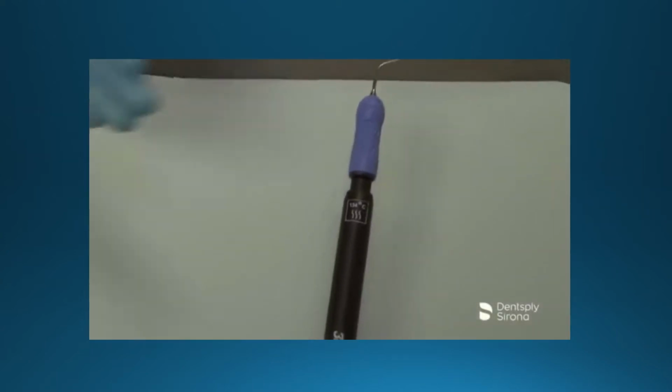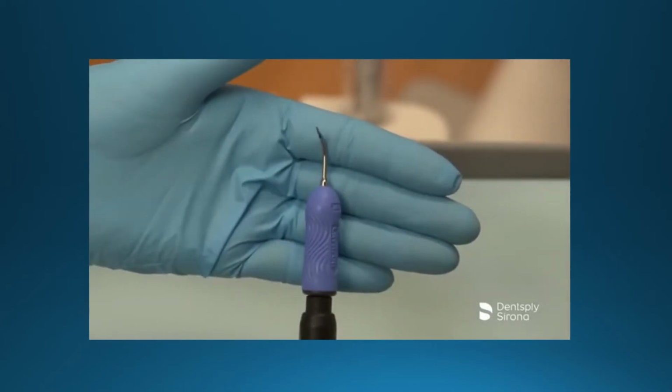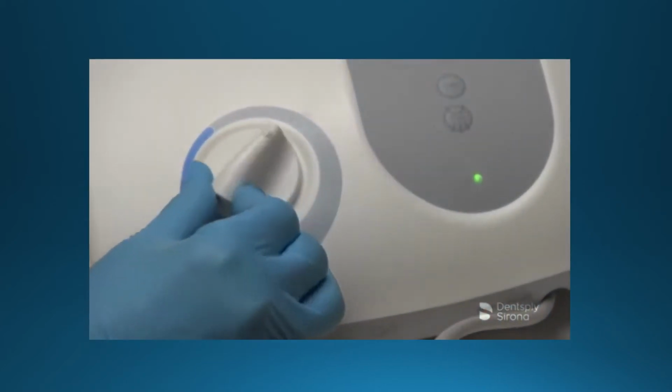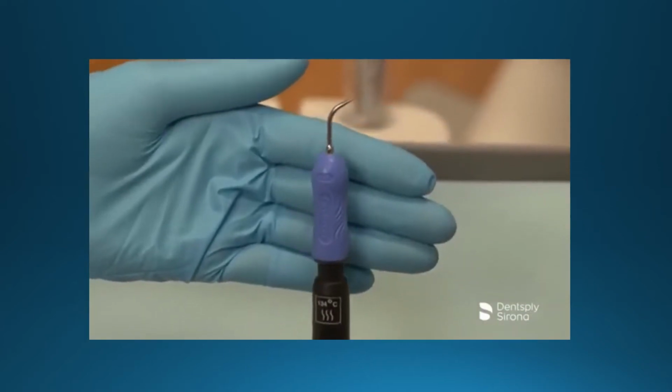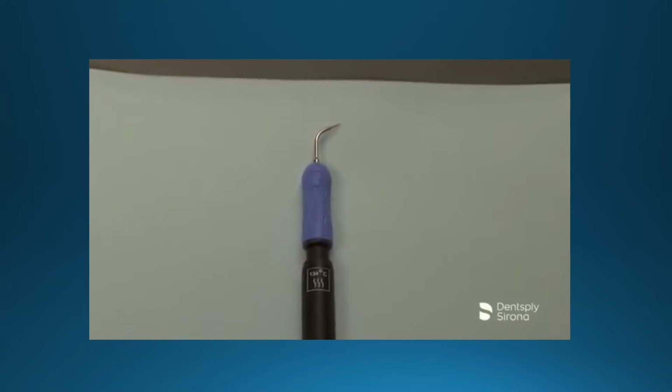This is the Cavitron FSI 10. It is designed for removal of moderate to heavy deposits, and it can be utilized at all power levels. The Cavitron FSI 10 has a straight shank and can be used on all accessible tooth surfaces.